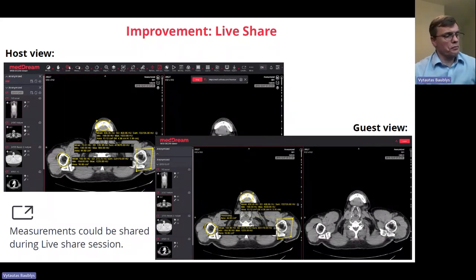Also, we are continuously improving our live share functionality. So we added the possibility to display not only the actions, zoom, move, pan, rotate, but also measurements. So now the measurements can also be propagated between the users.